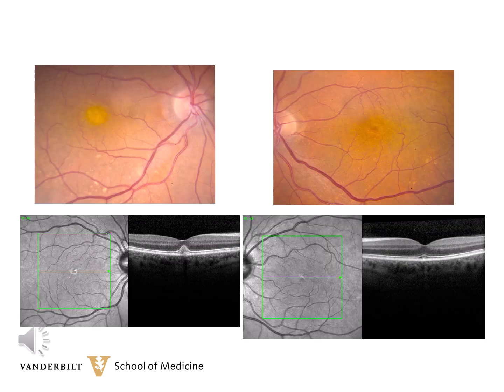So the answer may lie with the OCT. And here is the OCT. The right eye shows a well-developed, typical finding of pattern dystrophy with the hyperreflective subretinal spot in the fovea of the right eye. And then the left eye also has the hyperreflective material, but it's just not as well developed. This will give you the diagnosis of pattern dystrophy and not age-related degeneration.